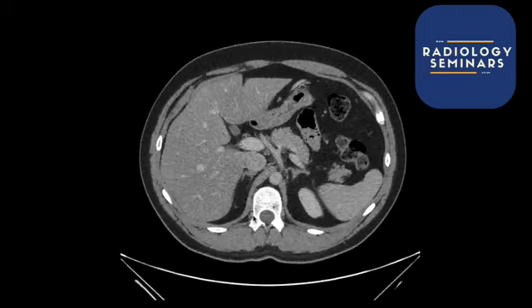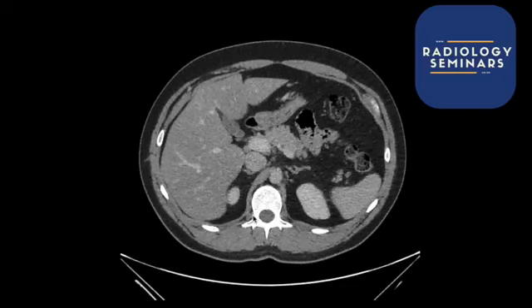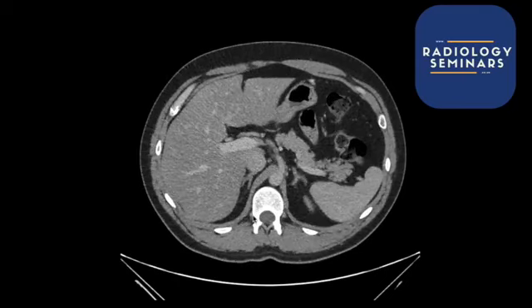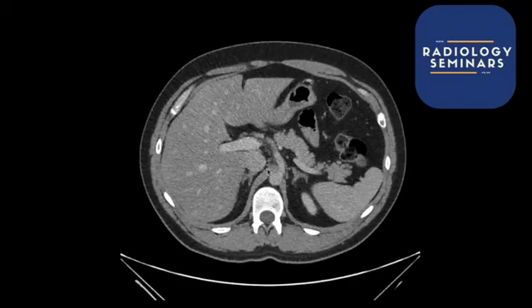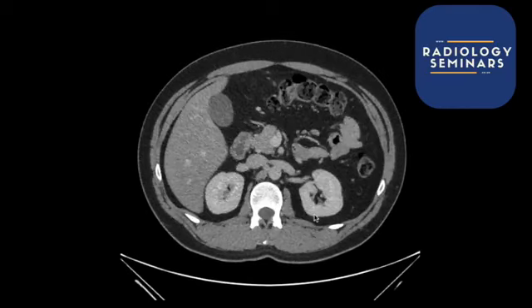You should always do one, but what I'm trying to say is that generally speaking, they don't usually end up being pathological. I think they call them incidentalomas, and maybe some of you might be aware of that phrase. But anyway, sometimes you could have a nodule there which may need to be investigated. If it's a low density lesion, i.e. the same density as fat, which is sitting over here, then you can be pretty sure it's very fat-rich density and therefore nothing to worry about.